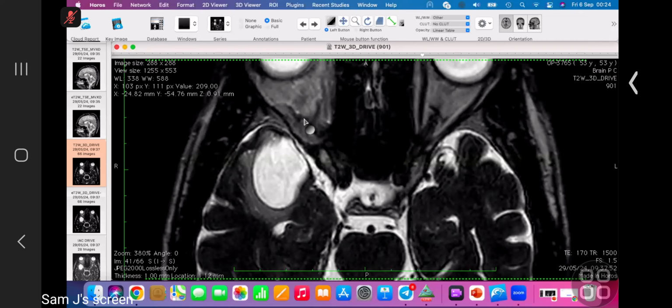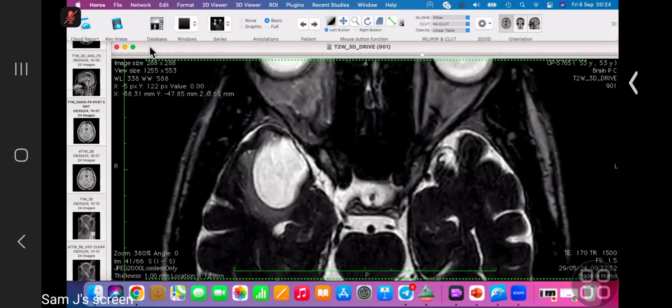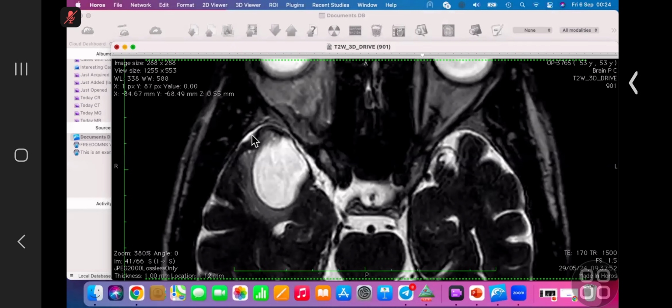Varix is again a very close differential; it will cause proptosis, and the vessels are quite dilated and tortuous compared to the hemangiomas. And these T2 hypointense filling defects are nothing but small calcifications. Okay, so this is about it. Then let's move on to the next case.